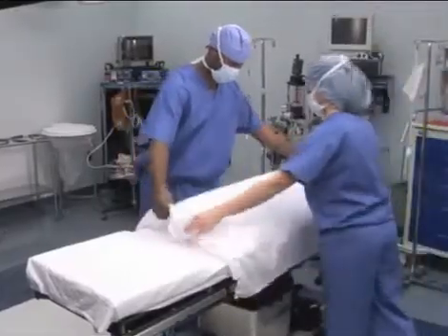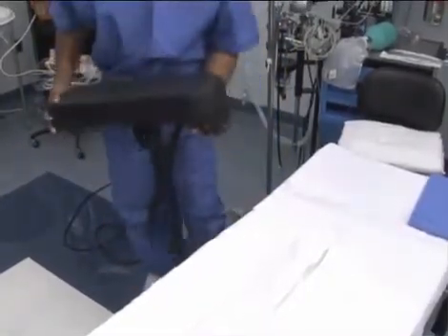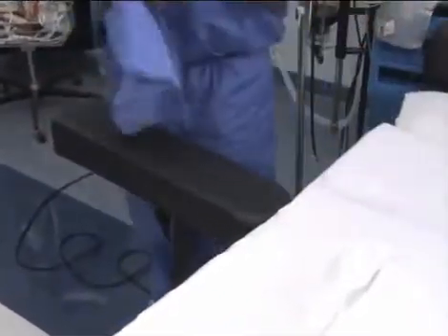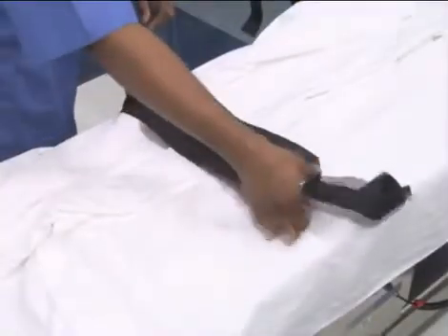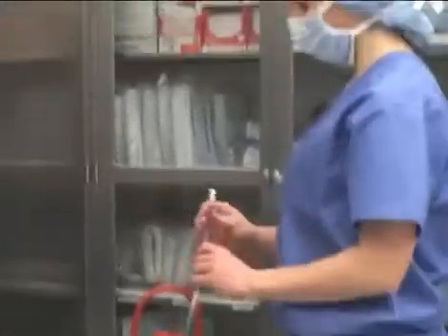Prior to the first case of the day, all surfaces are damp dusted before placement of equipment and supplies. Place clean linen on the OR table and be sure that arm boards and other table attachments are available in the room. Secure one end of the patient safety strap to the OR table. Connect suction tubing to the canisters, ensuring that the connections are tight. Pre-test the suction lines for adequate pressure.